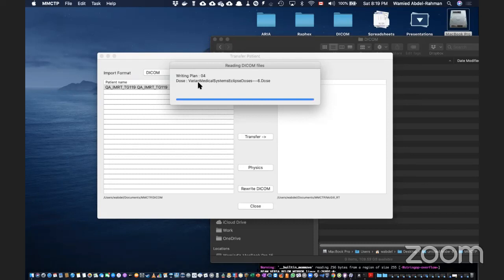And then when I import a plan with TrueBeam Ocean, it's going to complain, say, okay, I don't have a Linac called TrueBeam Ocean, but it will put it there, listed. So I need to go back to the BeamNRC configuration. And then all I need to do is just define what is the location of the beam model for that Linac. And it happened that I'm going to use exactly the same one for the Ocean Octopus.